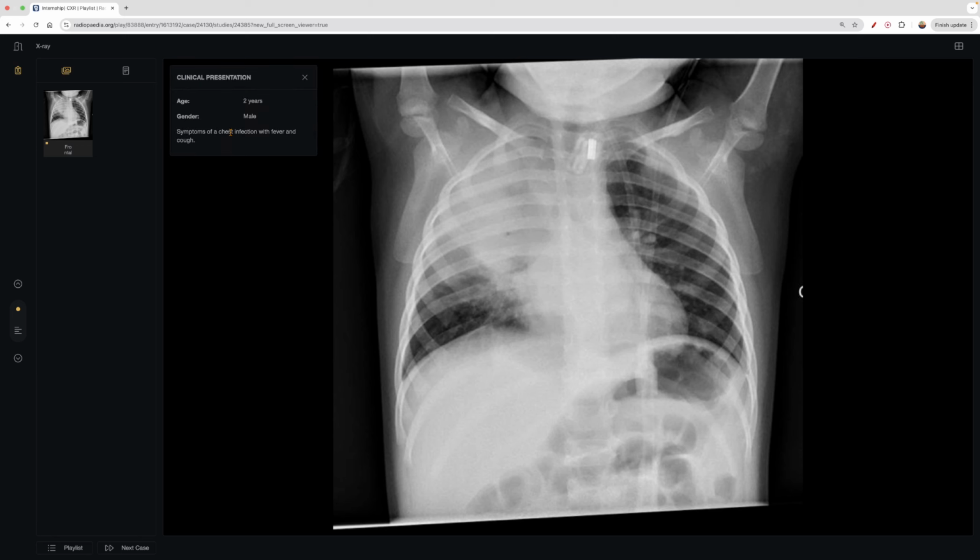Let's put this back up here. Chest infection and whatnot. And so you also see the paratracheal stripe is not as sharp. I mean, you can kind of see it maybe if you make believe. And so this is what a right upper lobe pneumonia would appear as. On the contrary, you look at the other side, there is no pathology.